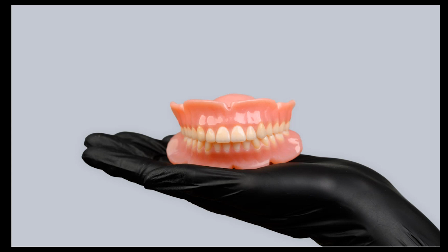Labels can be done either at this point or later down the line. Sometimes if you feel that your computer is slowing down when applying labels, you can save it to a later part of the process. Labels are changing the external colors of the denture, which makes the graphics resolution a bit higher, so it might be saved to a later part of the process.